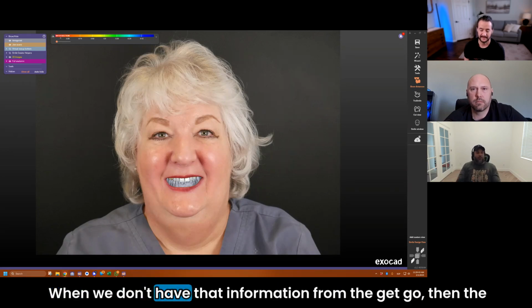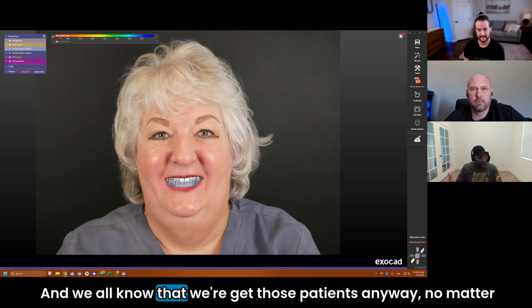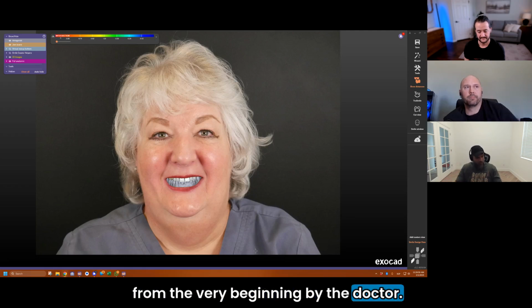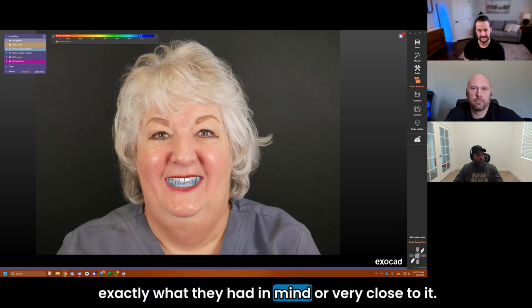When we don't have that information from the get-go, then the patient gets to get picky, right? And we all know that we're going to get those patients anyway. No matter what you do, they're not going to be happy. But it is a lot easier if the conversation about details was had from the very beginning by the doctor, and then that is forwarded to me.